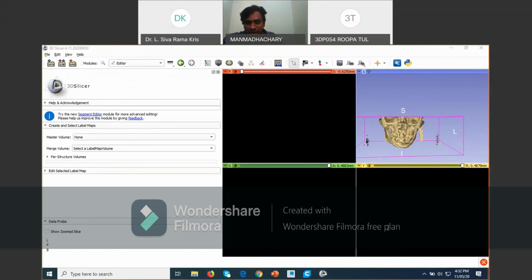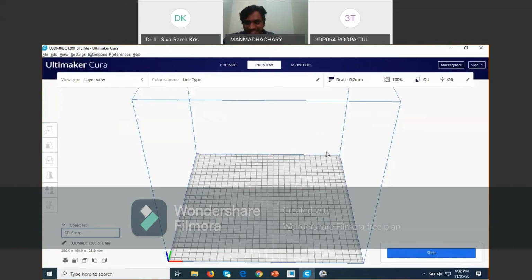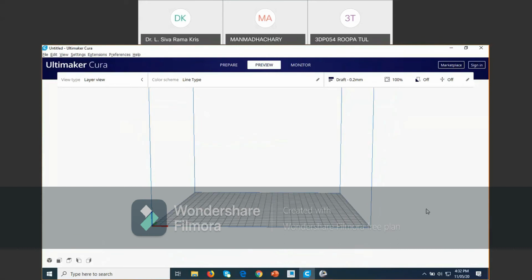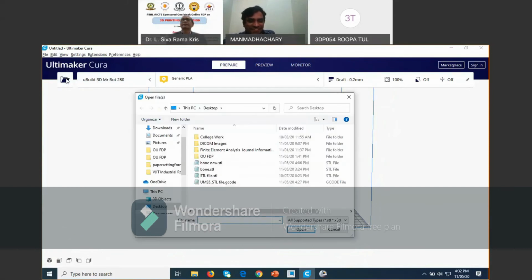Any problem while during your practice? Sir, please repeat the slicing process. I think Sir has already explained slicing. Where you want Mazaruddin was asking, please repeat the slicing process. He was asking. Yes, I'm doing so within 1 minute. Please, Mazaruddin, please see. Abhishek Tevta, you are unable to slice. How to get back to initial position is Anil Kumar is asking.